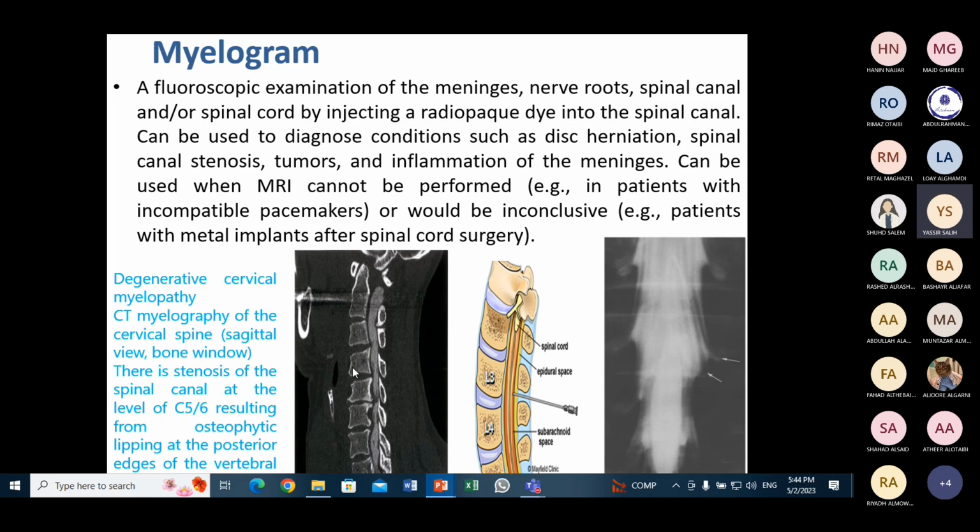In this patient you can do this CT myelogram. This is CT myelogram. لاحظوا إن this is the vertebral body, the sagittal. لاحظوا إن this is the spinal cord. There is a narrowing of the spinal canal at this level. اللي هي دي 1 2 3 4 5. Between 5 and 6 at this level there is a narrowing of the spinal canal. فسو this is CT مايلوجرام. ليش سميناه CT مايلوجرام؟ لاحظ انه في contrast in the subarachnoid space. This is due to شنو degenerative changes or osteophytes اللي هي دي المناخير دي الزوايد دي degenerative changes causing this spinal canal narrowing.